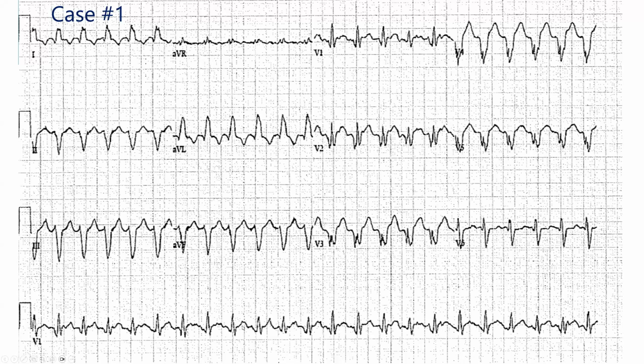And the timing of this notch, which is only intermittently visible, varies with respect to the QRS complex. And so, although this may represent supraventricular activity, given the irregular or the non-constant relationship with the ventricular rhythm, it's tough to say that this is an arrhythmia that's being driven by atrial or supraventricular activity.